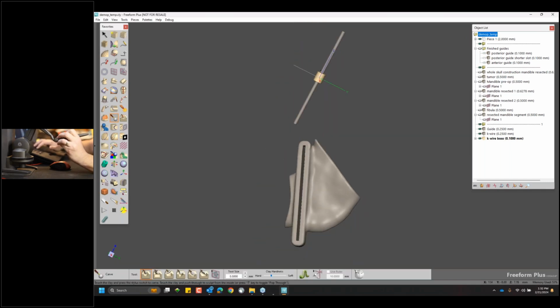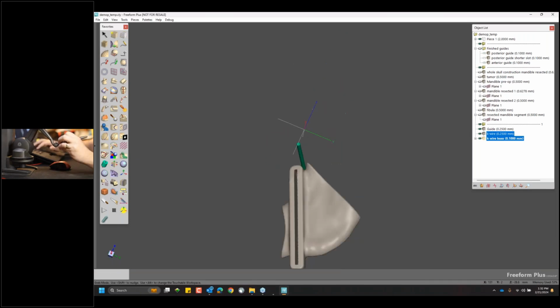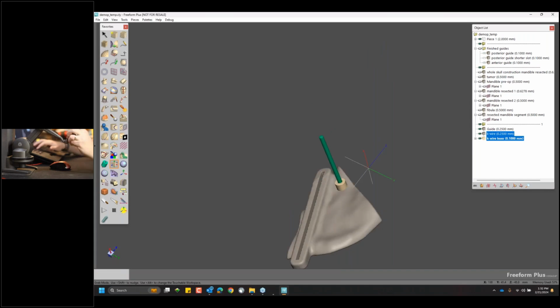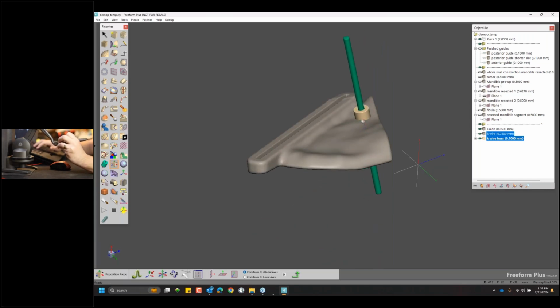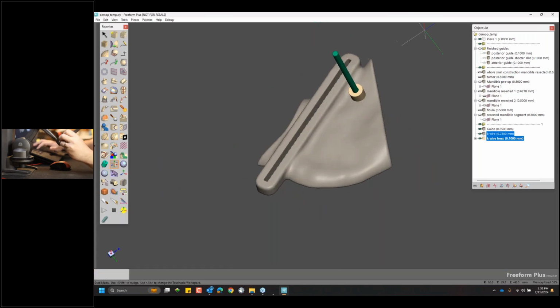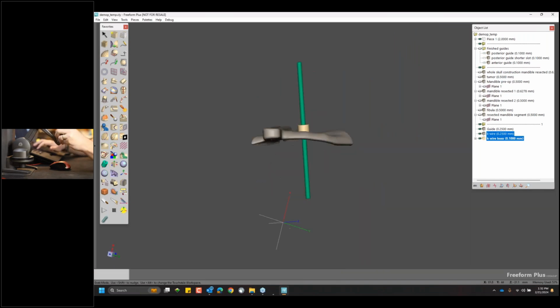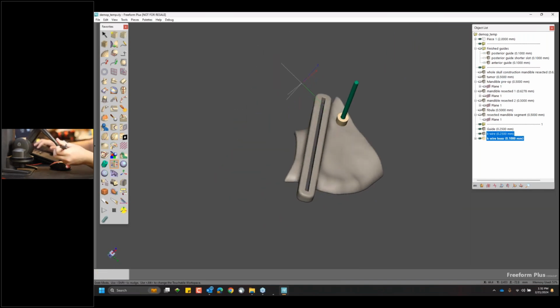It has the sleeve as well as the removal for the wire. With both of these selected, I can reposition these manually using my haptic device. So I will choose my reposition piece tool, and very quickly, if I turn off my guides, I can rotate this around, move this into place, and with the 6 degrees of freedom and the ability to line things up, see it, I can place this and do that manually. And that is a fantastic workflow because it's very similar to what you would do if you were actually creating a guide.